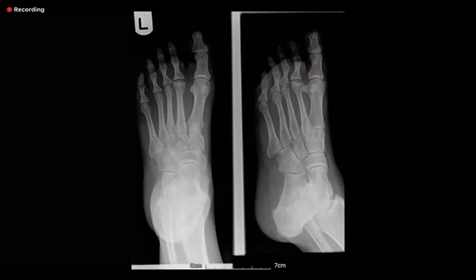We knew that. The patient had known AVN there. We knew it since the last 3-4 years, actually. So we are not interested. Your finding is correct. Your finding is correct.